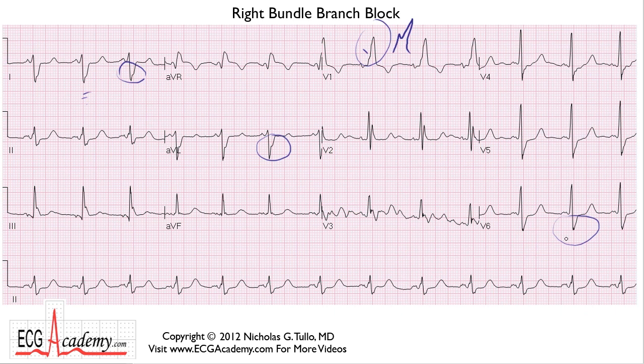You could call this RVH, but because the QRS is wide, in this case about 160 milliseconds, you really have to call this a right bundle branch block and right axis deviation consistent with a left posterior hemiblock. But I don't want to give away the next section, so just forget I said that. Anyway, recognizing a right bundle branch block is actually quite easy, but understanding why it looks this way is what will help you going forward, because understanding the physiology is what makes you an ECG expert.